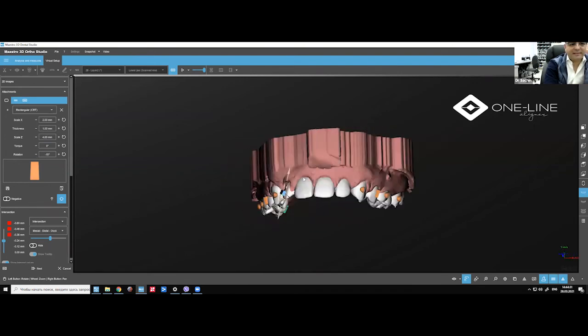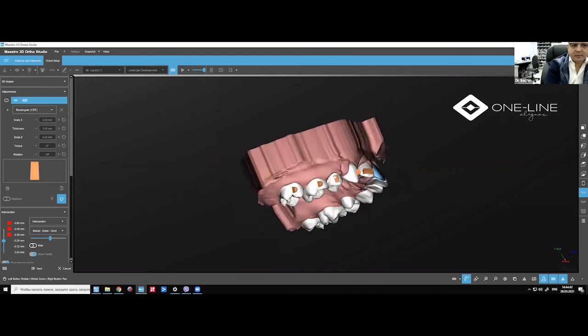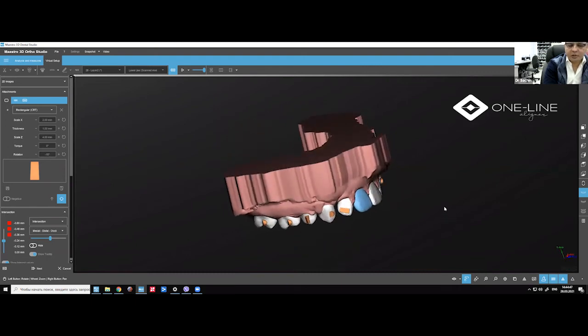Change the rotation, and this is what you can use. The other option for getting a tip is a bigger attachment, and you get it like this. You see now? It's a very, very big attachment. This will help you also in the tip.